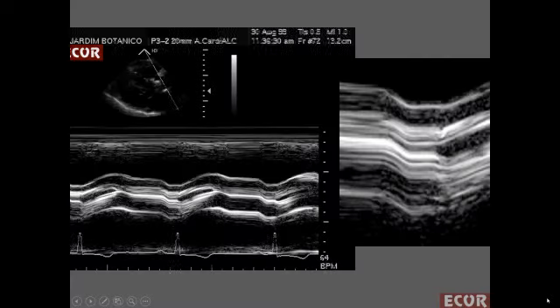If it is calcification, a calcified valve in M-mode echo is very characteristic. It shows several well-defined lines with perfect line borders. It doesn't matter if it is just a tiny calcification. It will have the same aspect of perfect lines with perfect smooth borders. This is a very important sign. The same thing happens with local thickening of the valve. If it is due to rheumatic or degenerative disease, it will show a single or multiple lines with perfect borders.